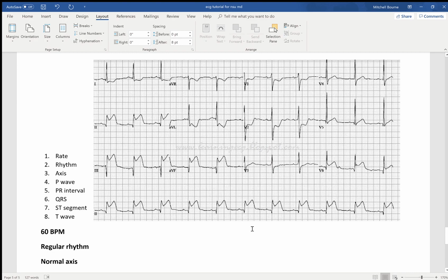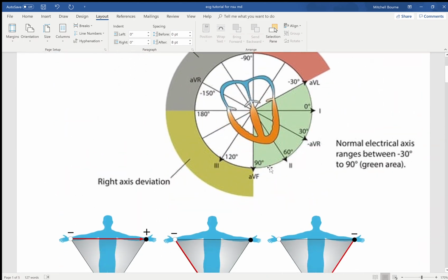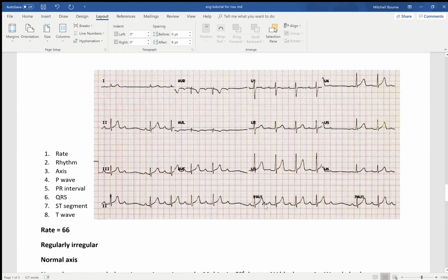Look for ST elevation. Remember, ST is between the end of the QRS and the beginning of the T wave. Okay, so let's look at 2, 3, and aVF. We go to the very top. 2, 3, and aVF are looking up at the heart from the bottom. So you're looking at this part of the myocardium, essentially the right ventricle and part of the septum, and very little of the left ventricle, okay? So that's inferior. Remember that acronym SALI I told you?